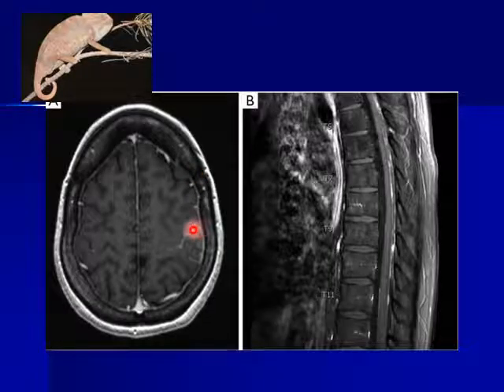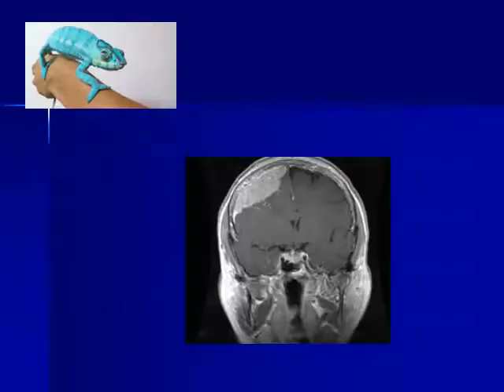It can present as leptomeningeal thickening and enhancement. Okay, you remember the CSF seeding metastasis. But it can present as the pattern of metastasis from extracranial tumor. This is a patient with cancer breast presented by leptomeningeal enhancement and pachymeningeal enhancement. Even in the spine, these are metastatic lesions. And unfortunately, it can present as a meningioma-like lesion.